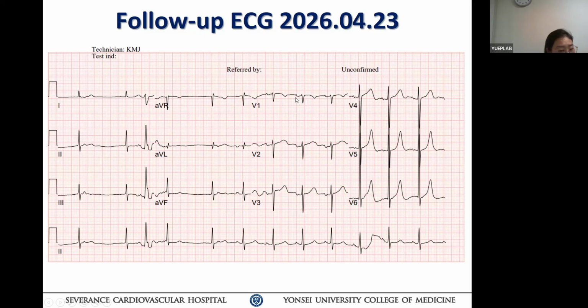Another thing I want to point out is that the P wave is notched, and the terminal deflection in V1 and V2 is very wide and deep, evidence of LA enlargement. Yeah, but still, I don't understand why the RR interval is so regular. Yeah, I agree. The hump overlapping with the ST segment is a P wave and a non-conducted APC, but why is the QRS regular? Any idea, Dr. Wang?